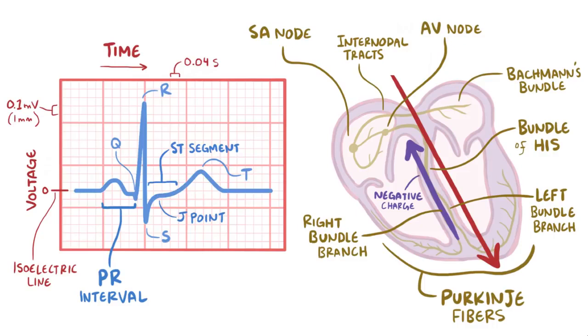The T wave is more spread out over time than the QRS complex because repolarization is a slower process that takes place at slightly different times for each cardiomyocyte instead of happening all at once like depolarization. It's also worth mentioning that atrial repolarization doesn't usually show up at all on an ECG because the small vectors created by it get lost in the much larger vectors created by the QRS complex.